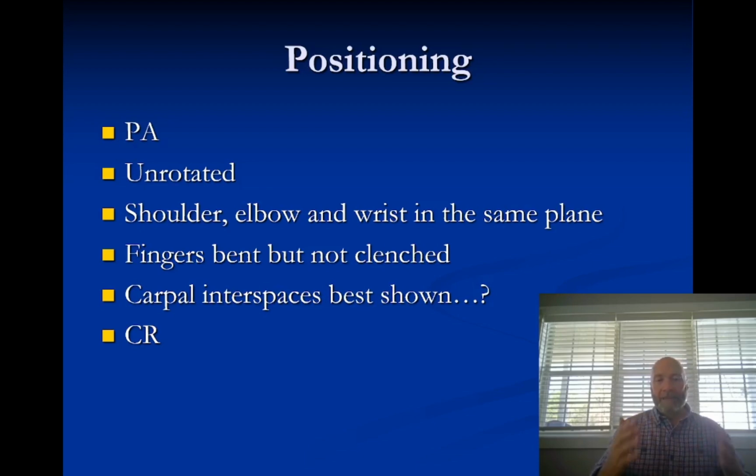So what that means is that if they're thicker on the posterior side, we usually shoot our wrist PA, which puts the fatter side closest to the x-ray tube and furthest from the image receptor. So what that does is it increases the penumbra, or the shadow, the unclearness. It decreases spatial resolution. So if we shot AP though, then our carpal bones would be more in line with the divergent central ray.